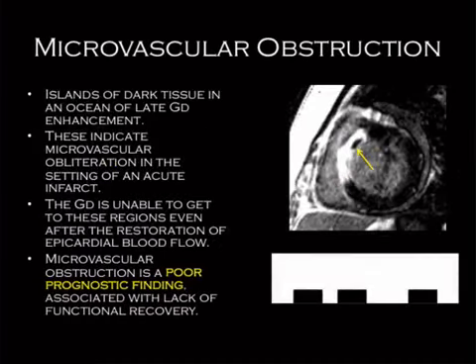This is what's called microvascular obstruction, and basically it's an area of vascular obstruction that didn't allow the contrast to get to that part. It's dead, but it didn't get contrast into it, so it didn't turn white because there's obstruction of the vessels.